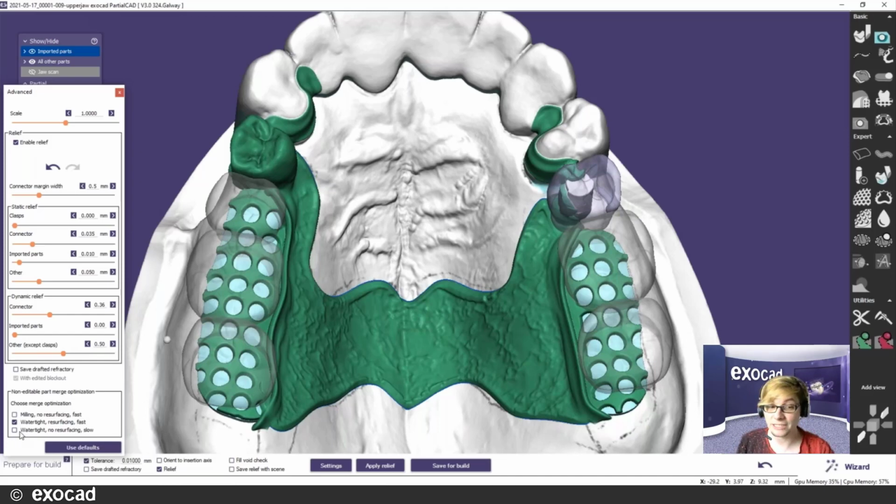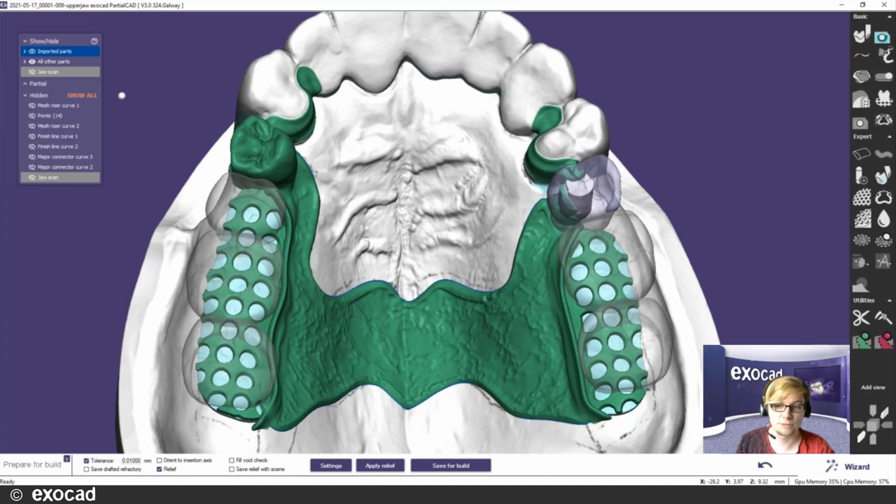This is a very complicated calculation. That's why it specifically says slow. It might take longer. It might not create a bigger file. I accidentally just said it, but it's not true. It just might take longer. That's why we put here slow. If you're going to create a partial specifically for that, you have an option here now, just so you know. I think it's very interesting.